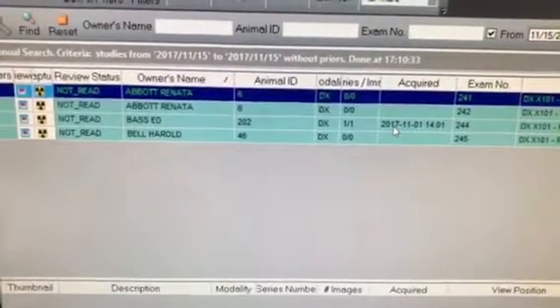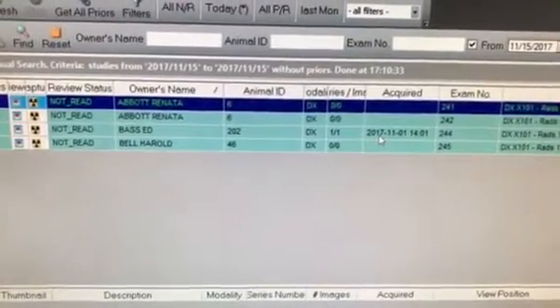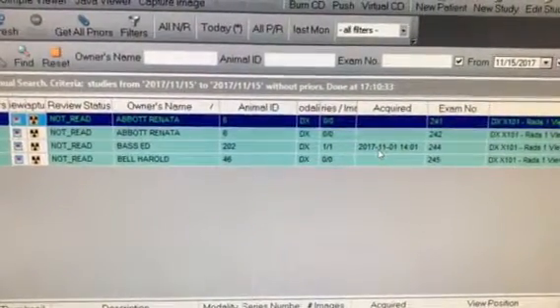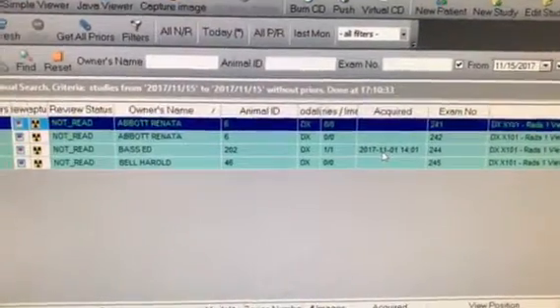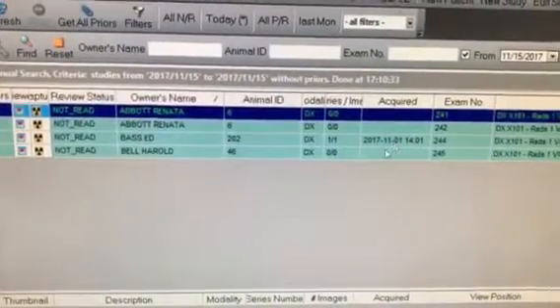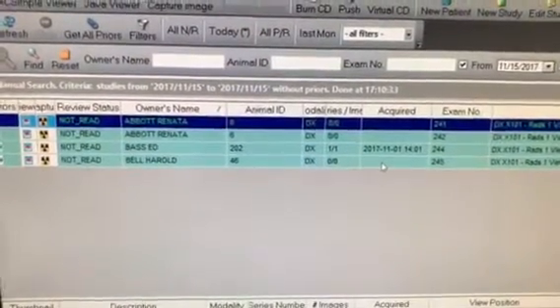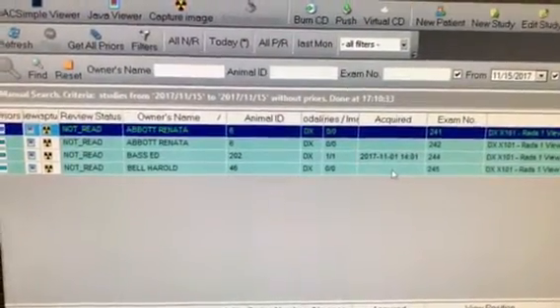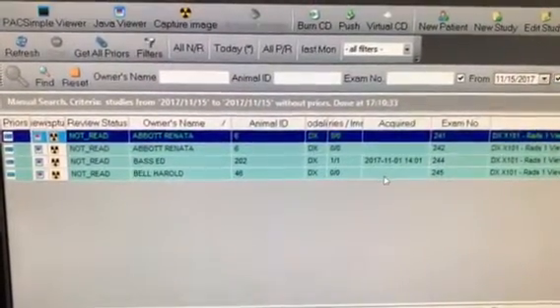At this point, the client information and patient information will be sent automatically from the PACS over to your X-ray modality. So there's no need to type in the patient and client information at the modality. It'll automatically be there in your work list order. You get there from selecting the work list in the acquisition software. Highlight it, acquire the images, close and send that study at the acquisition computer. And when that happens, then if I had an actual digital X-ray system set up here, I would then get an acquired time and date.